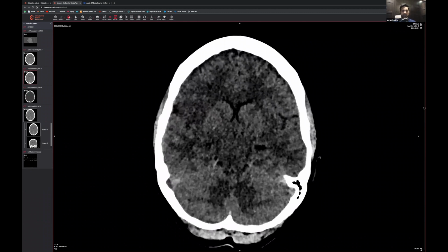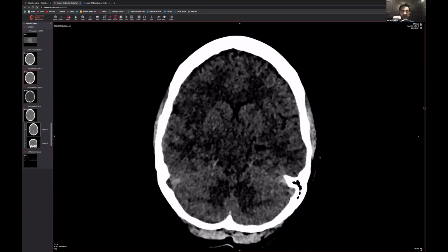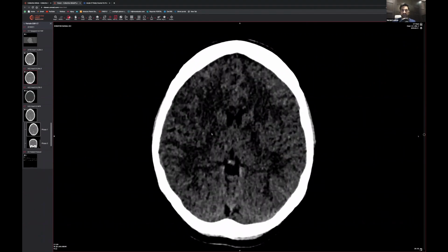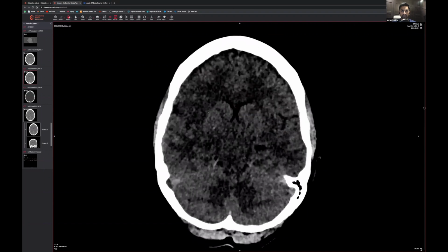around this area over here, once you've done that sort of gray-white matter differentiation thing, can you see that there is actually a difference in the gray-white matter differentiation? Okay, just in case someone doesn't know what I mean, this is gray matter and that's white matter. And what you should be able to see is a nice difference between the two, particularly on this window that I put on. The kind of freestyle there, haven't I?